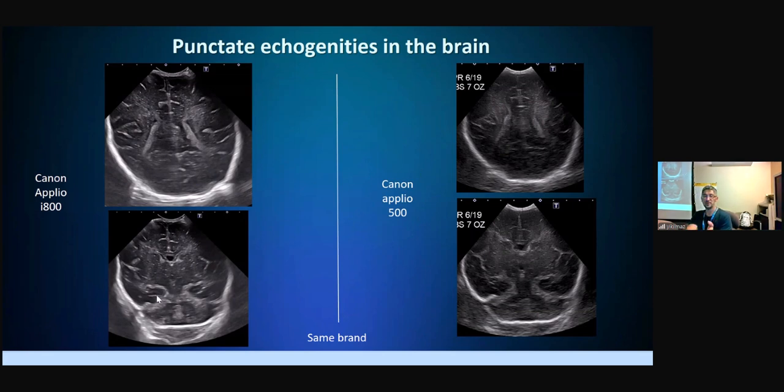So these echogenicities disappeared. Even the sonographers call these echogenicities calcifications, as you can see here. It really depends on the settings. Usually we never see this extensive calcification, even in infections. It's not like that. So it's just the settings.